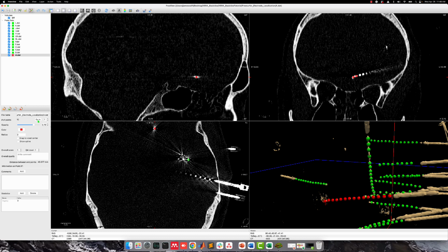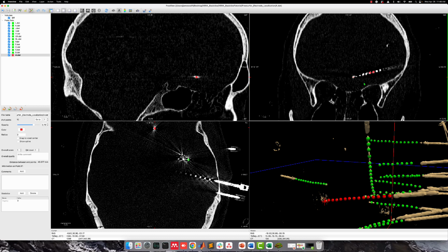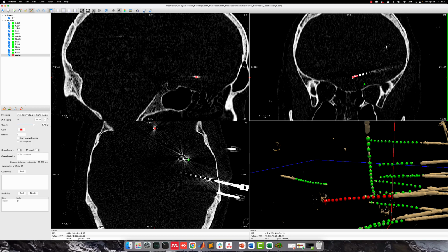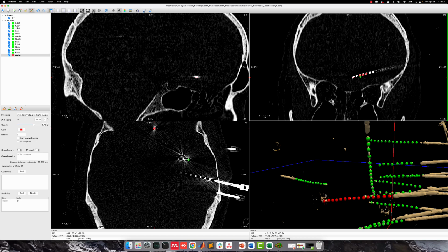To add or edit a point, use the Point Set Edit tool and left-click on the slice view to place a point. Points can be moved by left-clicking and dragging, or removed with Shift-click. Try to align the points with the densest parts of the CT in the slice view. Often, it is necessary to adjust a point's location in all 3 slices to ensure it is placed accurately.